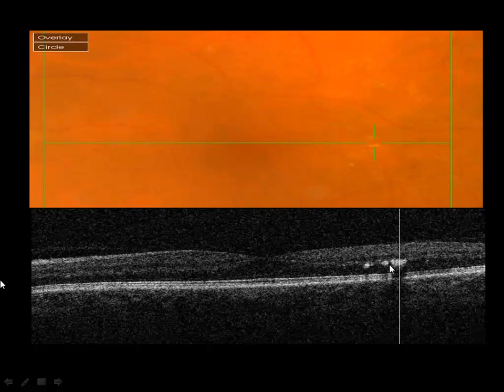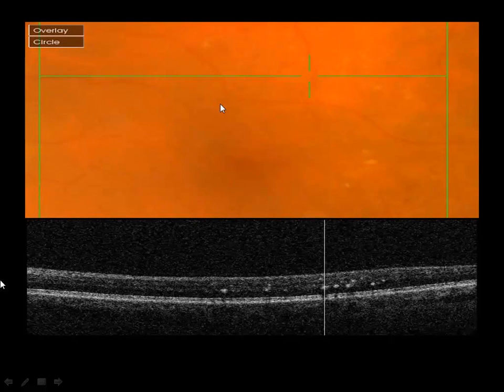This one you can see clinically. That one shows up. That's big enough to show up. The two next to those, still in the outer plexiform layer, don't show up clinically. We can now take a slice above, and in this entire slice, we really don't see any exudates. However, when we take that horizontal slice here and we count them, we have about 10 exudates in the outer plexiform layer. So overall, and I've done studies on small numbers of eyes, sometimes the ratio is 20 to 1, sometimes it's about 10 to 1. But virtually, you always see far more exudates, these white spots in the central part of the retina, with spectral domain OCT than you will with an ophthalmoscope.